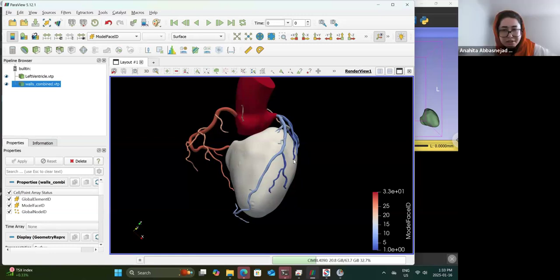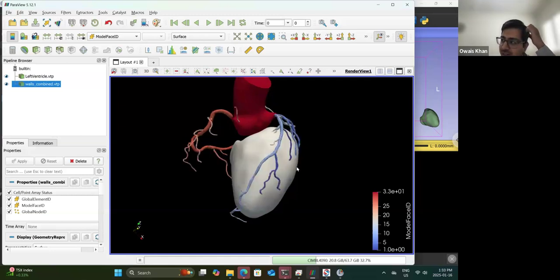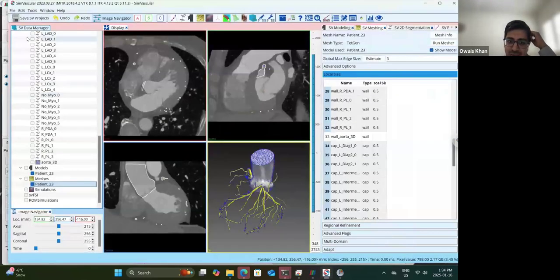Yes, the first one is going to take too much time for you. It was the same for me as well. But then at the end of it, you're going to do it very fast. You're going to recognize the vessels very fast. So right now you probably look at the image and you won't be able to, but once you've finished doing the 10th patient, you're probably going to look at the image and be able to figure out what is what just by looking at the images. So I think it just takes a little bit of time, and that's all.